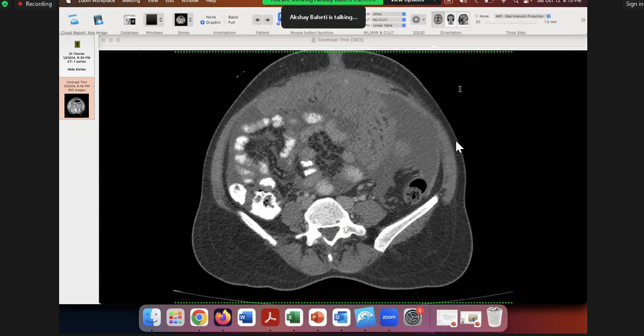Orkun is asking, if a lesion originates from the surface and extends into the parenchyma, what should I call it? Yeah, Orkun, then you say surface hepatic deposit which is infiltrating the parenchyma. And that is still stage 3. It's not stage 4. Okay. Visar kindly asks to comment on splenic met again. So again, a surface splenic lesion apparently invading the splenic parenchyma, that's still a surface deposit. It's not an intrasplenic met. With ovary or with most cancers, it's very, very uncommon to see intrasplenic met. So almost always I don't worry about it.